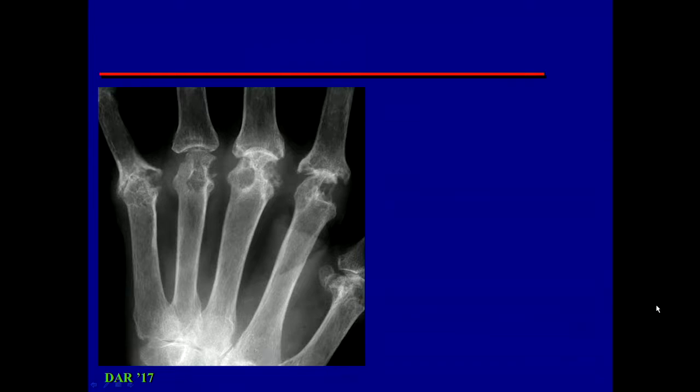So what about this? Here's a patient now. We're looking at the metacarpophalangeal joints, and I see these sharp edges.